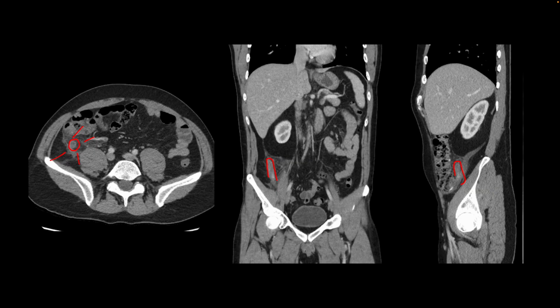So this is bread and butter for abdominal radiologists or emergency radiologists. When we see acute appendicitis, we want to make the diagnosis and also tell the surgeons the location of the appendix. So here I would say that the appendix is retrocecal. So this is the cecum, it's behind it and it's pointing superiorly. Sometimes the appendix is long and it may be in the pelvis in this fashion.